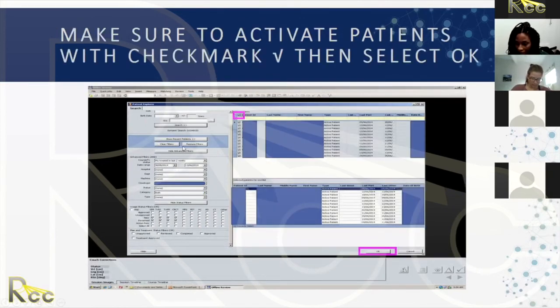So once you've done that, again, we asked for patients treated in the last 2 weeks who have either new or reviewed scans that have not been approved. It pulls up this list for us. And I'm just blocking out patient information. There's this checkbox at the very top. Make sure to click this checkbox, because once you click it, it selects all of the patients, and then it brings them in systematically, one after the other.